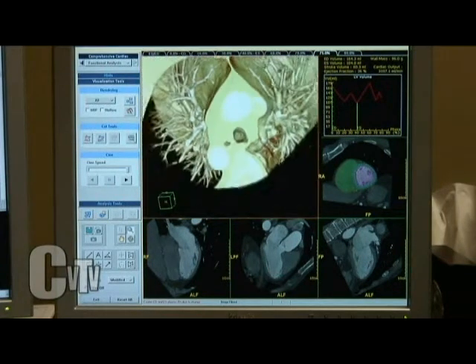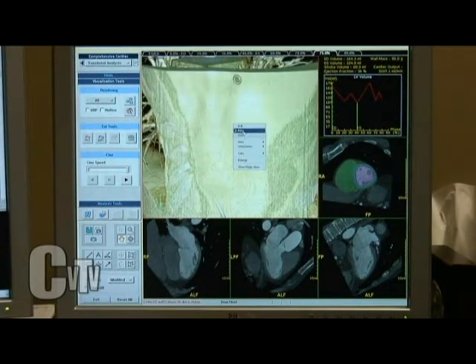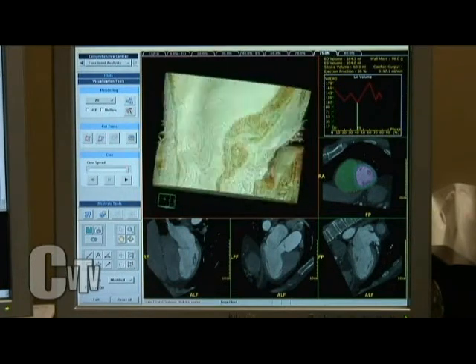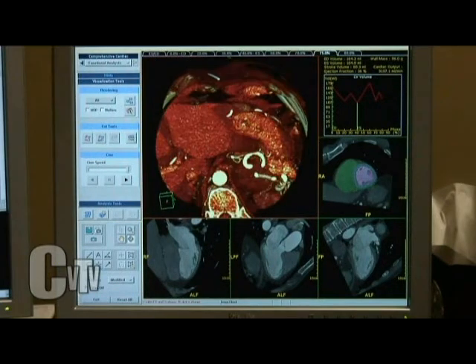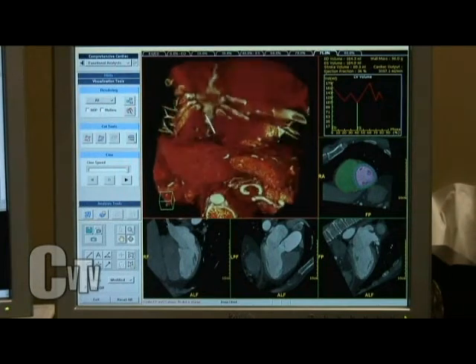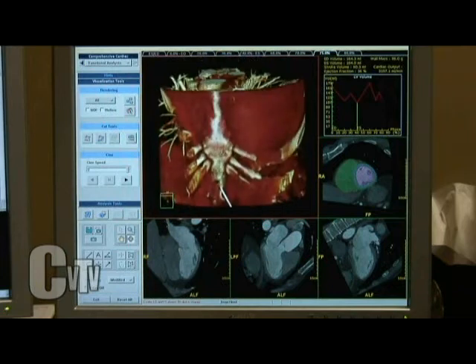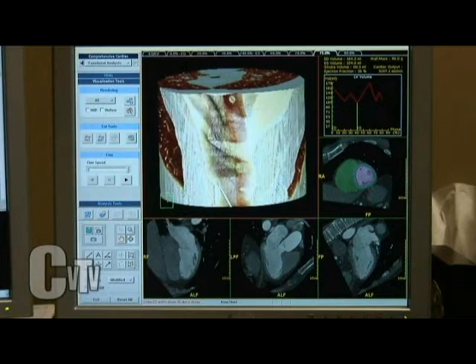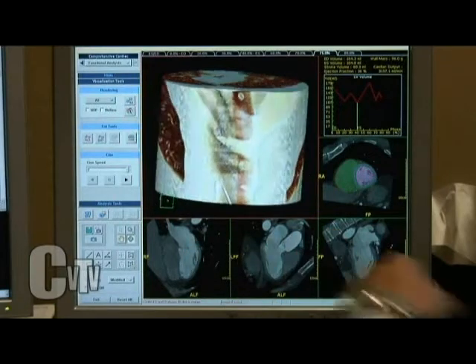And then lastly, I call this, now we've entered into the realm of stupid CT tricks. What I'm going to do now is there's the whole scan and the lungs, liver, spleen, all of that. There you are from the bottom. Stomach here, liver. There's the spine, spinal cord, aorta, the top. Now what I'm going to do for fun is I'm going to put his shirt back on. So there's his shirt right there. There's the buttons right there. There you go. That's it, Scott. Voila. It's the virtual autopsy.